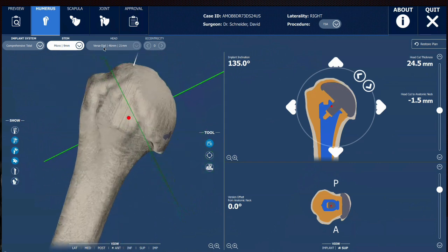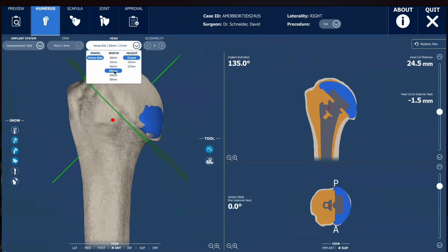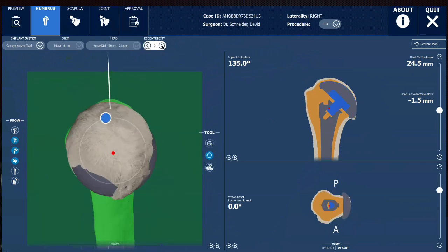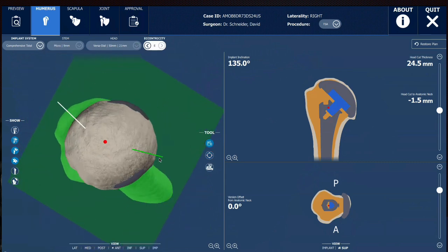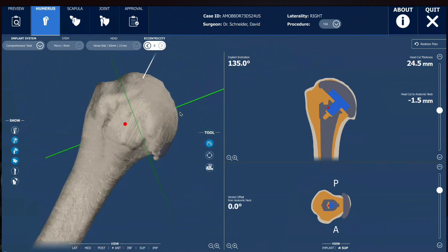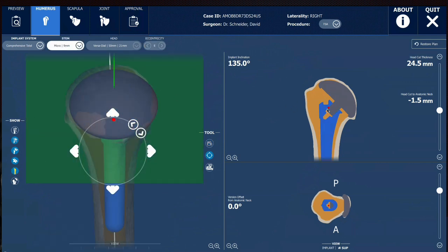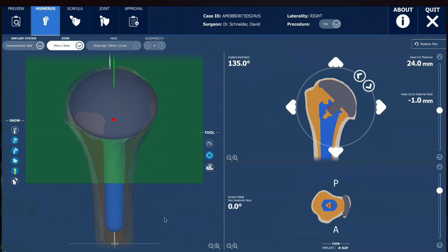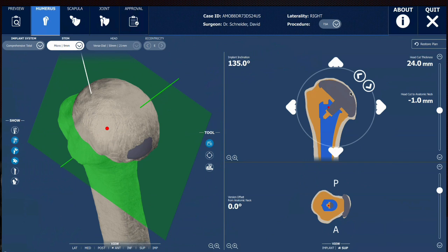You can see by placing both on the computer, making it blue, you can see it just poking out from underneath the bony surface. And if I make it bigger and bigger, it'll actually be too big. I can also then change the so-called eccentricity of the implant. I can make it so that it's not perfectly centered and spin it around to get greater coverage. What we're trying to reproduce is getting the replaced metallic humeral head basically where the old humeral head was. And I always tell patients, based upon your philosophical outlook, it's either where Mother Nature had it or where Father God had it.